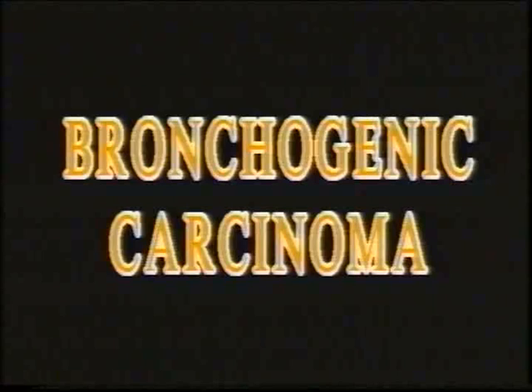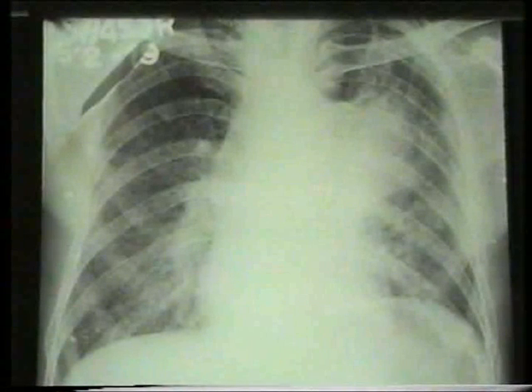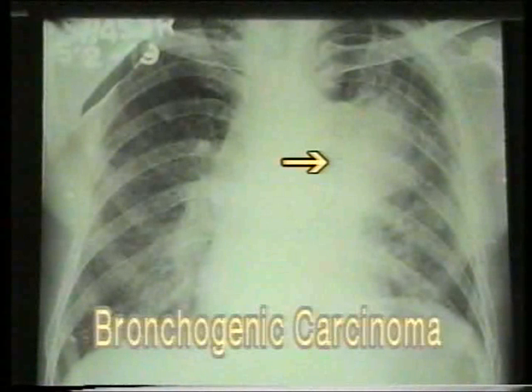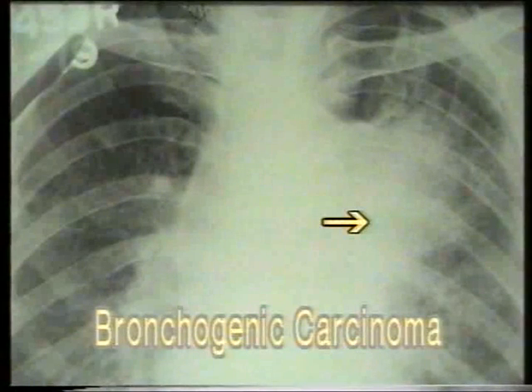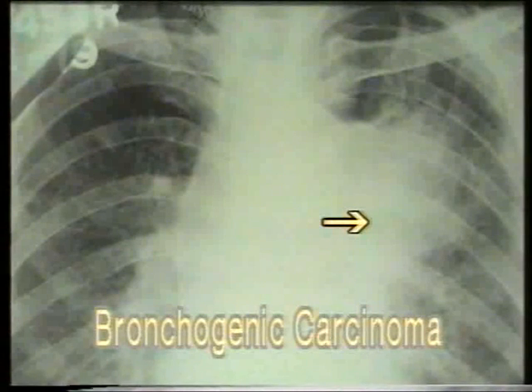Bronchogenic carcinoma. Whenever bronchogenic carcinoma is suspected, an X-ray of the chest must be taken first. A bronchogenic carcinoma arising from the main bronchus produces a dense homogeneous opacity in the region of the hilum continuous with the mediastinal shadow. In this X-ray, note the homogeneous opacity at the left hilum shown by the arrow. Note that its lateral border is not sharp, but it is spreading into the tissues. This is an important feature of bronchogenic carcinoma.